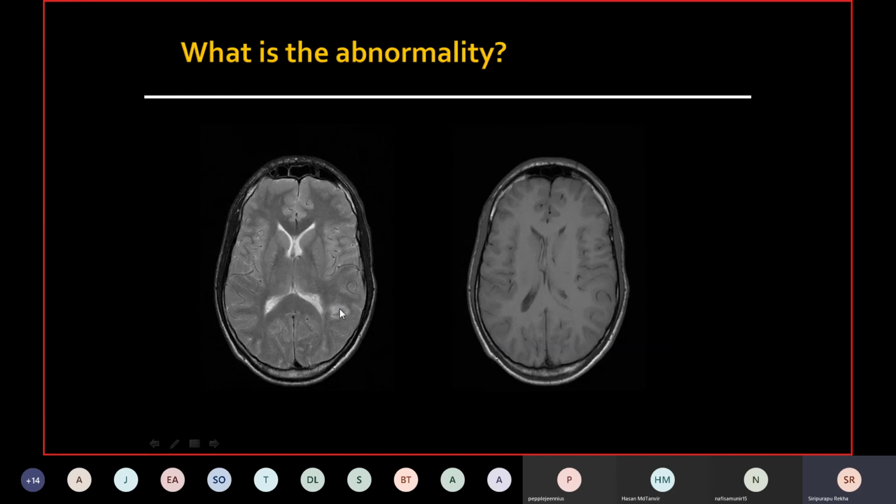Another case here. This time this patient came in with vague symptoms, and I remember very well because the first imaging investigation he had was an MR because they were querying demyelination. And we see this focal lesion within the peritrigonal white matter, and one wonders, is this an acute demyelinating plaque? It is very easy to miss on the T1 the asymmetry between the lateral ventricles. So here you can see the normal CSF in the trigone, and there is effacement here, but it is so easy to miss.